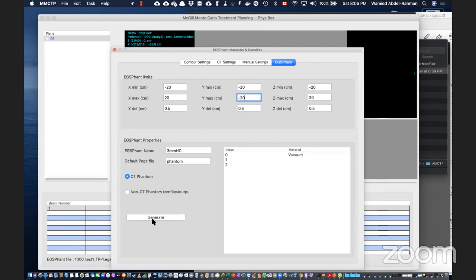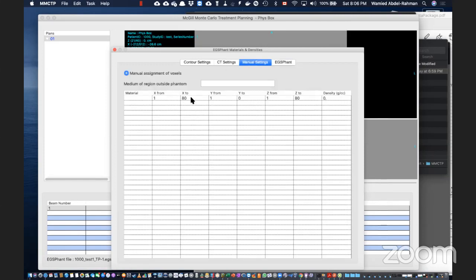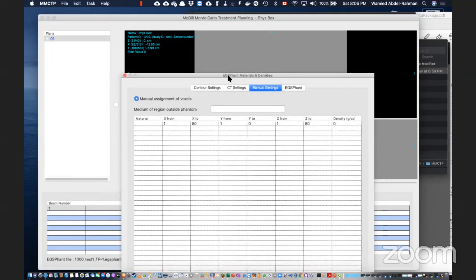And generate? No. You'll want to go to manual. So no non-CT phantom, right? No, incorrect, sorry. The non-CT phantom is for the commissioning phantom that I was talking about. But this is exactly what I want, Andrew. I want to get an output. You still will with this. The non-CT phantom will not use the images that you've imported into that patient. You're still using these images, even though they're virtualized fake images. You'll still want to use them, I believe, for your purpose.